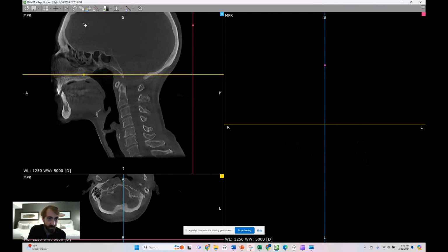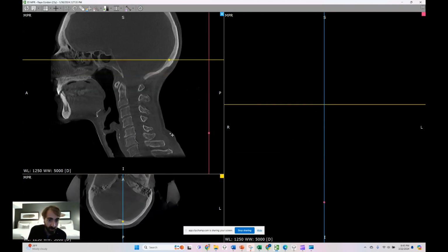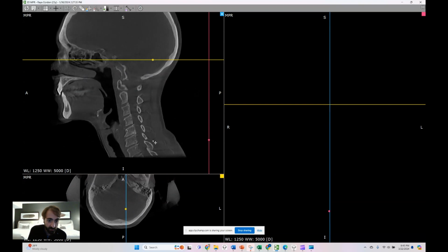So yeah, this is not great because she's only 23 years old, and you can already see some arthritis starting to develop in this lower cervical. 2, 3, 4, 5, 6, 6, 7. So you don't get that without a car accident. Yeah, look at that retro right there.